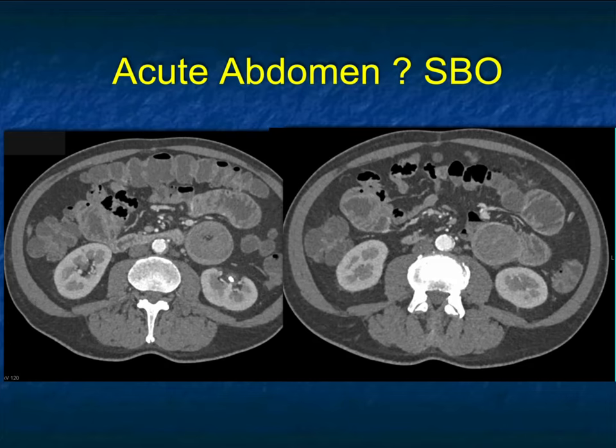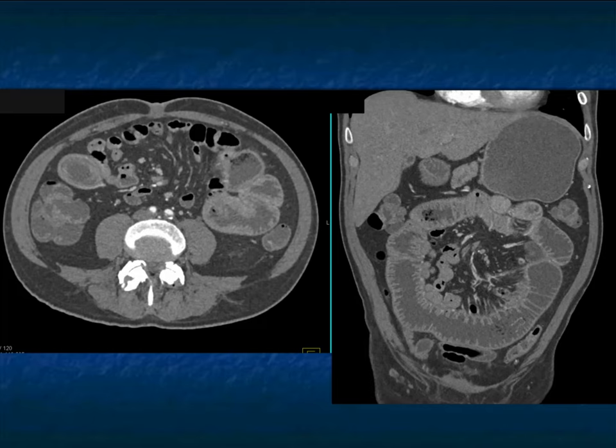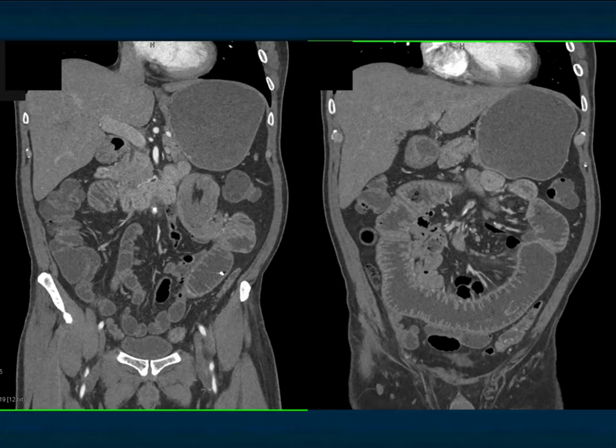Now, the thing about intussusceptions is sometimes they're intermittent. We talk about that in the jejunum, but look at this case, small bowel dilatation. Here's on axial views in the jejunum an intussusception. But when you look closely at it, it looks like it has mass effect. Here you see stretching and twisting of the vessels and of the small bowel. There you see the dilated bowel. We see the transition point right here where the intussusception is.